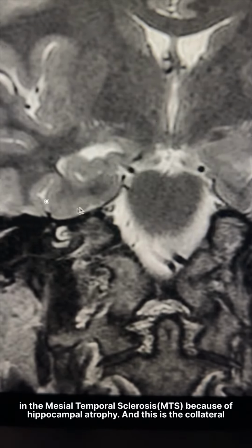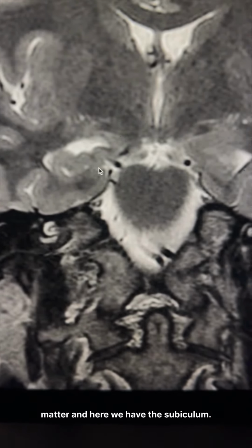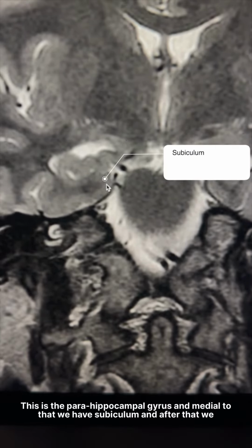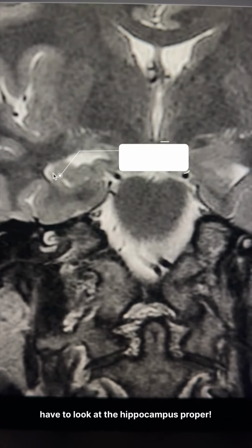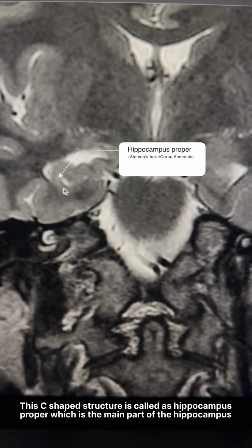And this is the collateral sulcus, and just medial to that we have the parahippocampal gyrus, which is gray matter. And here we have the subiculum. This is the parahippocampal gyrus and medial to that we have the subiculum, and after that we have to look at the hippocampus proper. This C-shaped structure is called the hippocampus proper, which is the main part of the hippocampus.